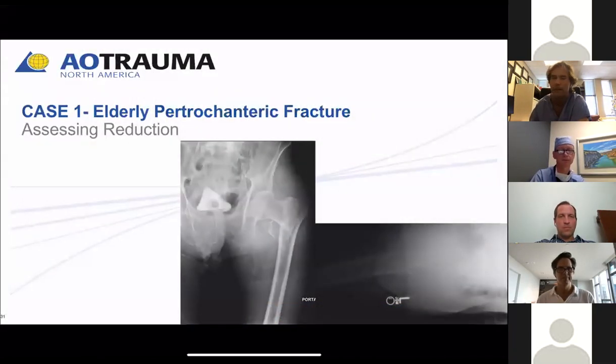All right, now we're to cases. And I'm going to get the faculty involved because I'm interested in how they're doing these, because I'd love to figure out ways to improve my practice. But we're going to start with a real simple one. So this is a puffball, but there are going to be some questions about it that will go past the puffball nature of the case.